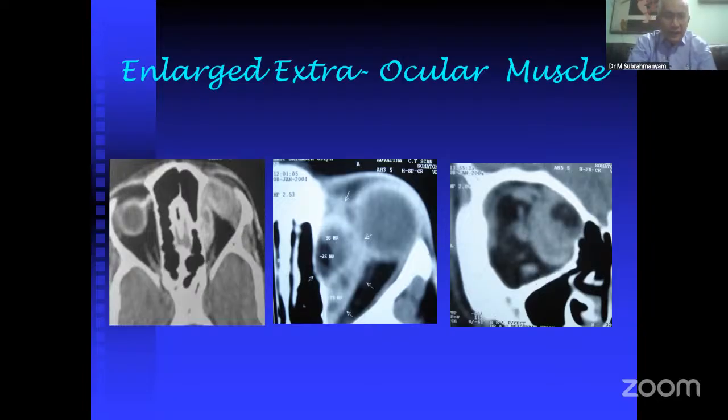intracranial cysticercosis, that's called neurocysticercosis, can also be associated. These are all the myocysticercosis components. The medial rectus. You can see the cyst and you can see the scolex. This is the enlarged medial rectus in a case of myocysticercosis.